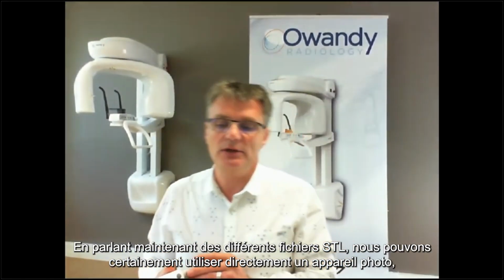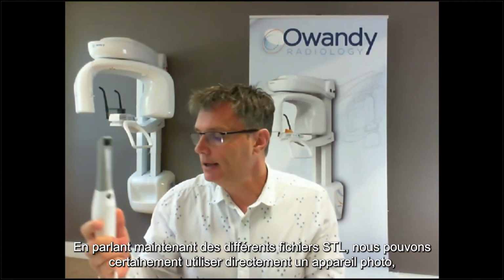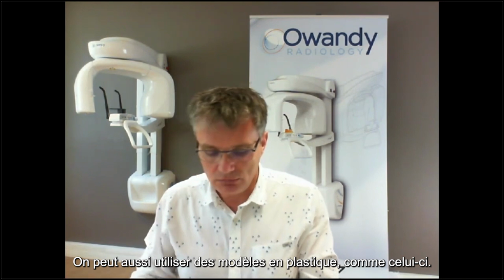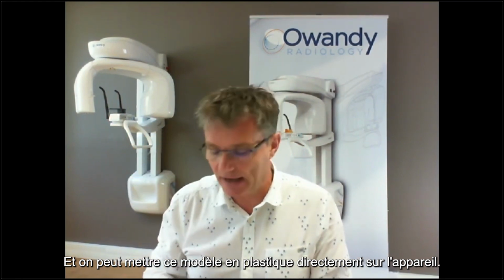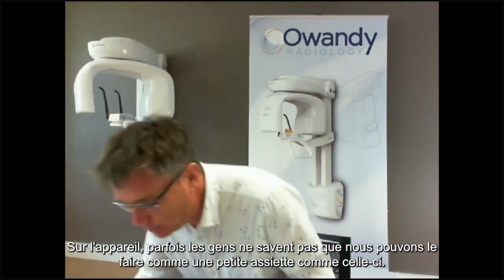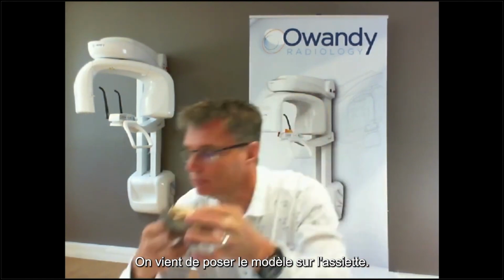Talking now about the different STL files, we may use for sure a camera directly and scan the patient. And while we scan the patient, we get the STL file. We may also use plaster models like this, and we may put this plaster model directly on the device. It's very easy. On the device, sometimes people do not know that we may use a small plate like this. We just put the model on the plate.